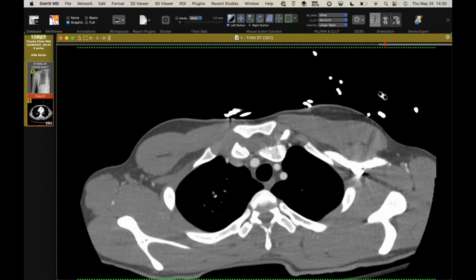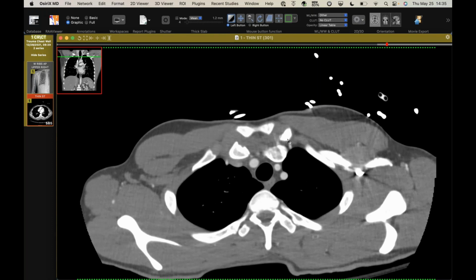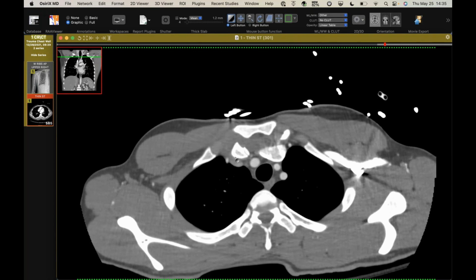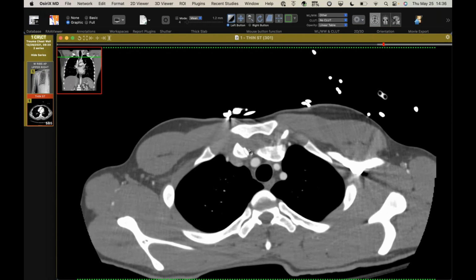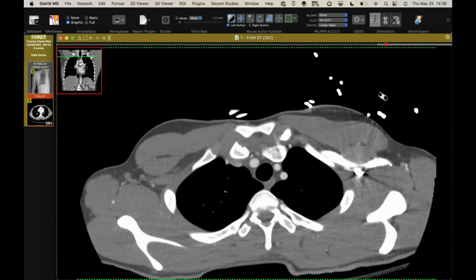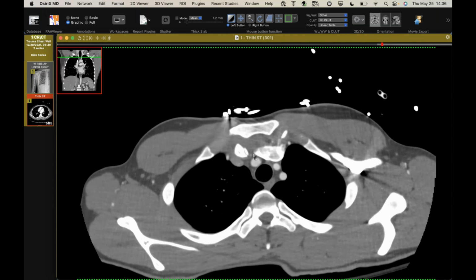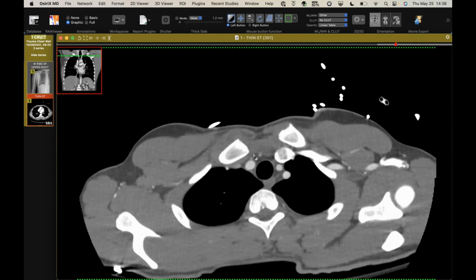And this joint, depending on the position, their arm can change position, but you'll notice the alignment here on the left, the clavicle and the manubrium are lined up, and there's a joint capsule here. On the right, you'll see there's this clear step off. He's 18, so he hasn't even closed his physes yet. So that's what that bone is there. So this is a posterior dislocation.